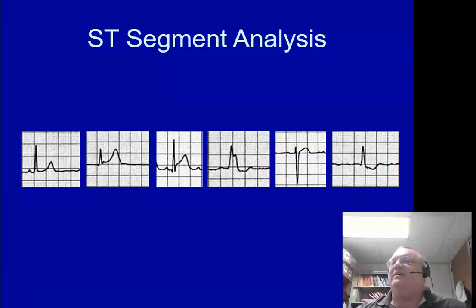If I take a look at this one here, is it elevated? It's slurred up, but I wouldn't say that it's elevated. Versus this guy, I think I have elevation compared to this segment here. This one is definitely elevated, without a doubt. This guy here, depression. This one here, not quite sure about that one. I think you may even have one little box there.